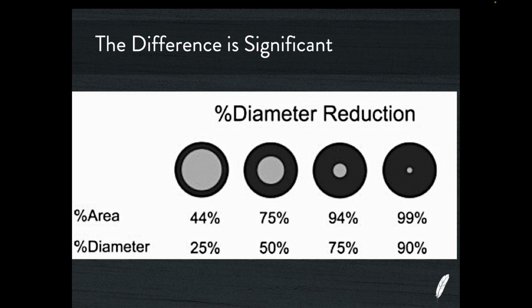It's really important not to put that number on your worksheet and have that number reported, because the reporting that we do with carotid stenoses, as we do with all stenosis in the arterial system, is in terms of diameter reduction. So you can't do this trick and report the number mathematically that you arrive at. You then need to convert your area reduction to a diameter reduction, and you can see when you do that, it makes a massive difference. It takes it from 75% area reduction back to 50% diameter reduction.